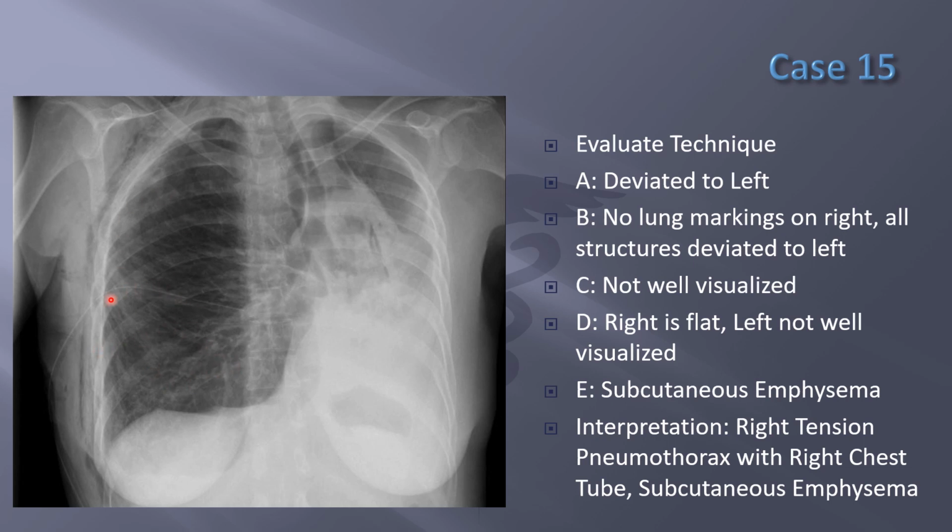In this type of situation, if this chest tube's not working, you have to put another one in. Sometimes, even though this chest tube looks like it's inside the chest, if it's not placed right, it can actually ride under the skin above the ribs and not be in the chest cavity. So that's why a second one might need to go in. And also you want to check this whole line, make sure it's hooked up to a Pleurovac and suction and all that stuff. And that'll be another talk. But you need to troubleshoot your equipment if this is not being corrected. This is still a medical emergency.